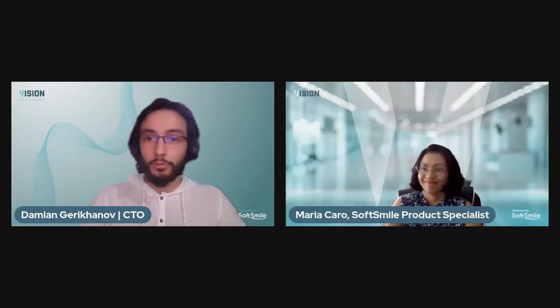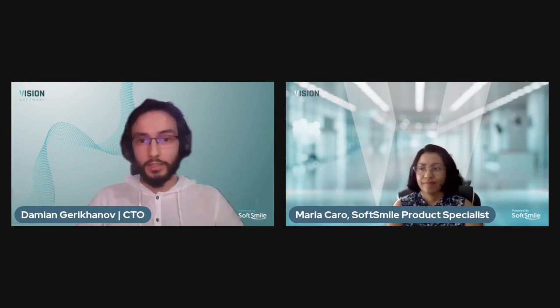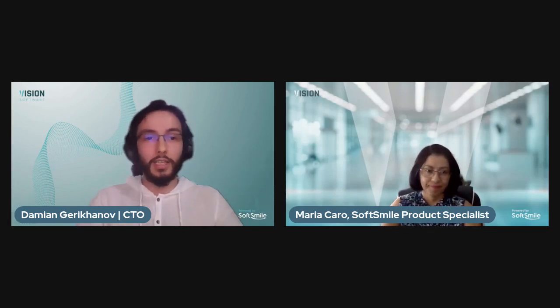So she's going to be doing a demo of the aforementioned CBCT functionality, and we'll see exactly how it works and exactly how it fits into the other ecosystem of functionalities in the Vision software.